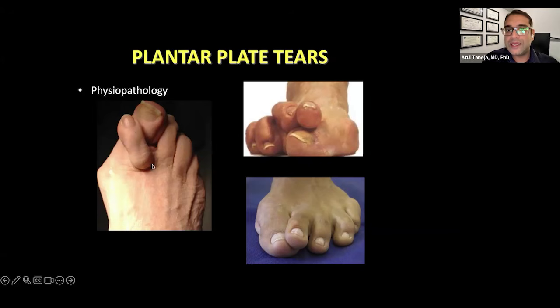The second toe has the MTP hyperextended overlying the greater toe, which is showing a hallux valgus deformity. So we have a classic crossover toe deformity. And this is a very severe case on the clinical examination, so easy to see. But we need to remember that we can see that on x-rays. We can see, even though they are in the early stages, if we see a mild subluxation of the second or third proximal phalanx, just be careful, you might be dealing with a plantar plate tear.